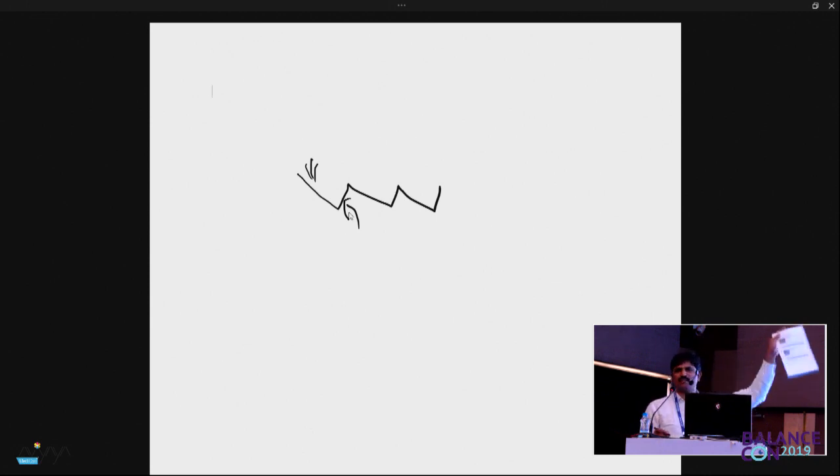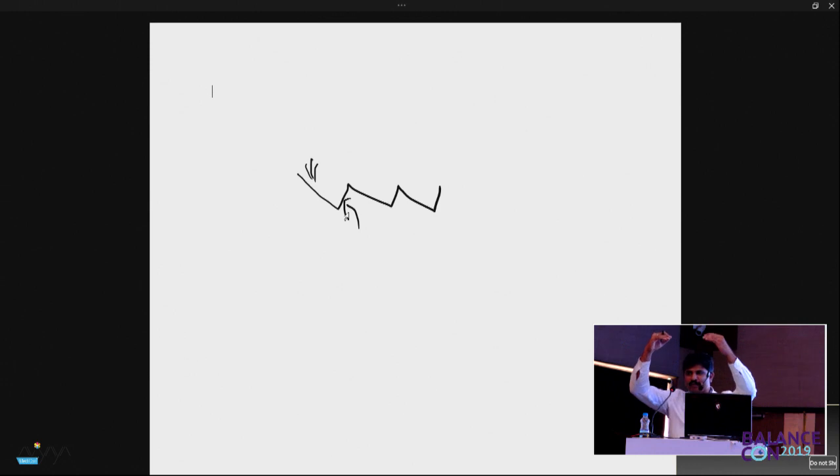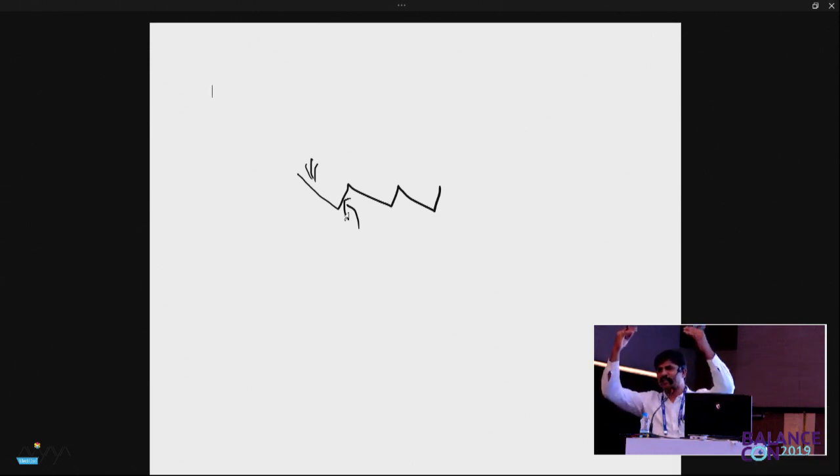When you look at this workbook, the first one, is it showing an up beating nystagmus? That is the expected nystagmus in optokinetic stimulation when the screen is moving from top to bottom, slowly moving the eyes downwards as the visual field moves, and making a fast saccadic correction in the opposite direction. In a purely vertical stimulation, what is not expected? Horizontal nystagmus is not expected.